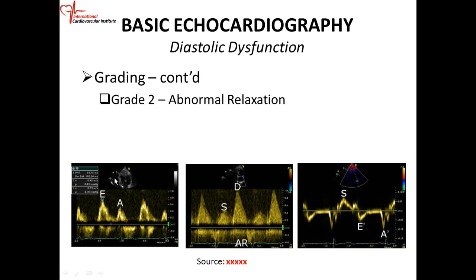So your mitral inflow, two-dimensional echo is on top. Your cursor is there. The sample volume is at the tip of the mitral leaflet. So in diastole, that's what we're looking at. You have your E velocity. You have your A velocity. Okay. You see the E is bigger than the A. So there's a tendency to say quickly that this is normal. But let's look at some more parameters.